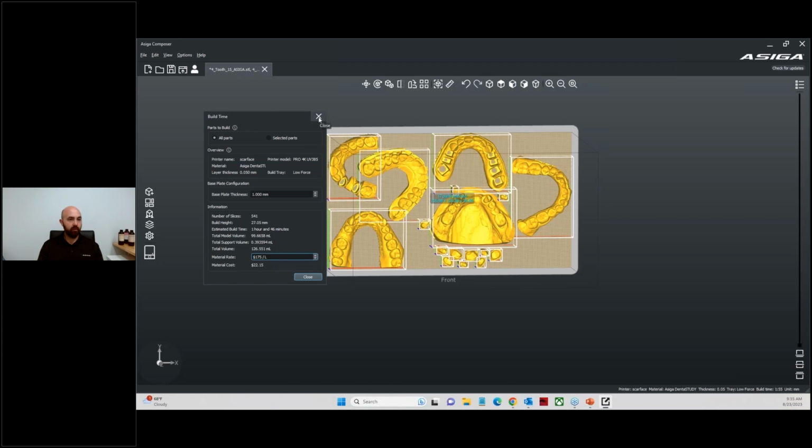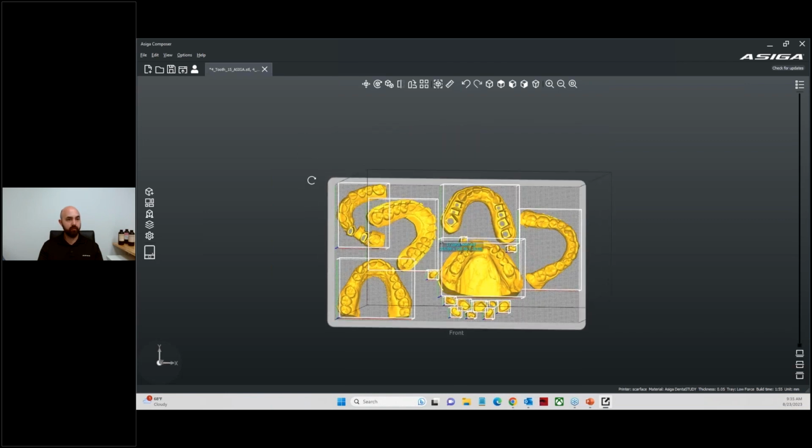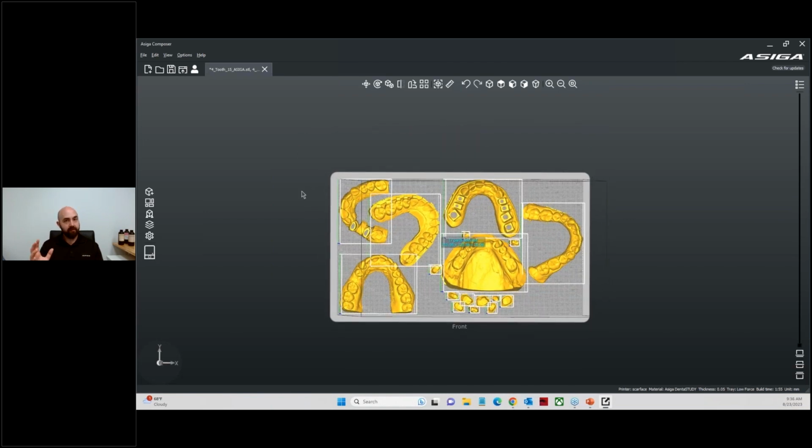This is something that is no longer on the screen. It used to be a clock that was on the screen, and that has since been removed. Another feature that has changed, or another icon that has changed that you're probably used to going to, is the globe icon. The globe icon is what you would use to view the web interface.